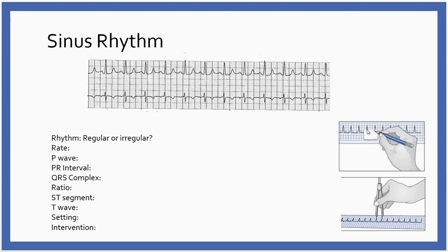They marked from this beat to this beat, and then take that as a ruler, so to speak, and move it to check this to this to this, that it marches all the way through. And if we do that, we see that this rhythm is regular. Okay, so we are regular here.